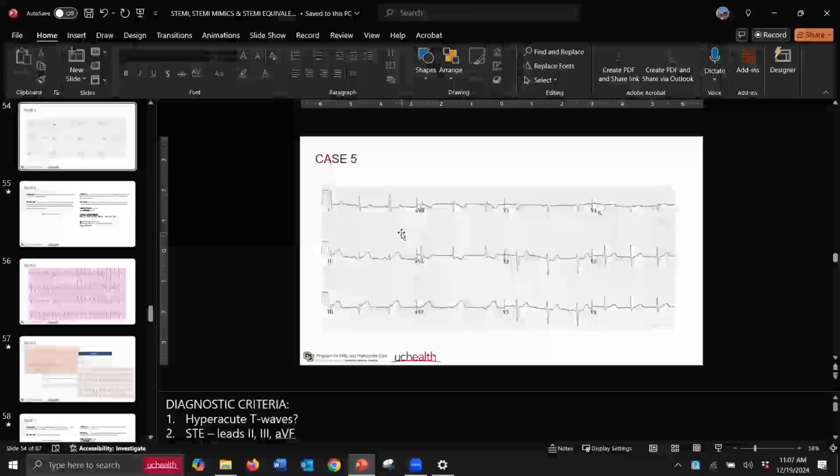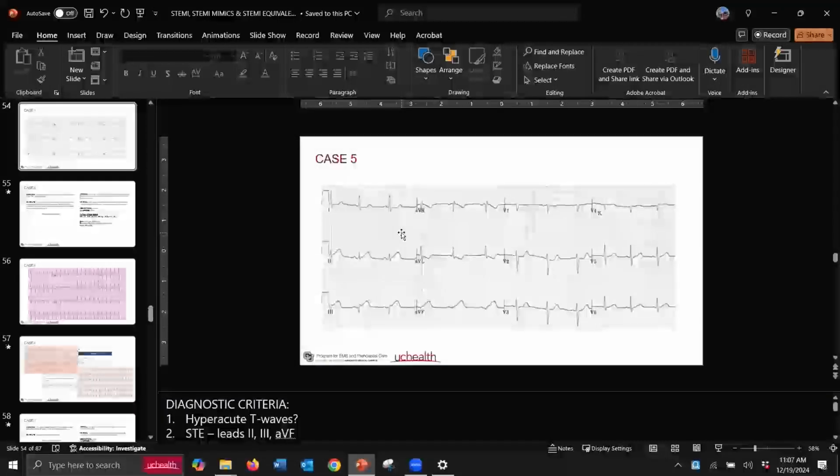If that's the standard, then I agree with you, 100%. It's another thing that the whole Dr. Smith OMI thing came up on. It increases sensitivity. Understood. Because you're right, this EKG doesn't look all that bad. Now, would I do serials? Absolutely. I would expect this to evolve even more, but it still meets STEMI criteria.